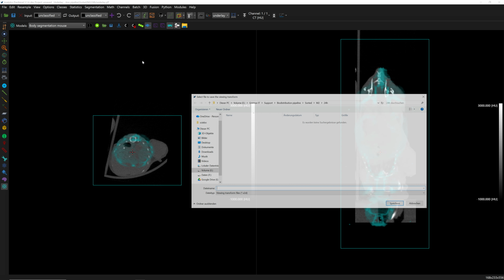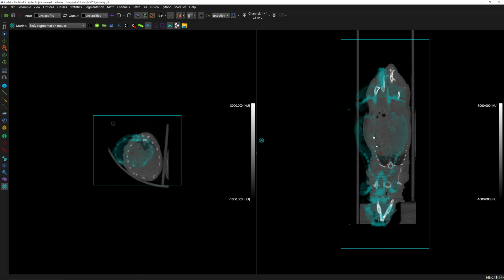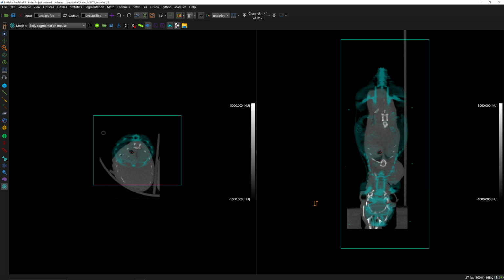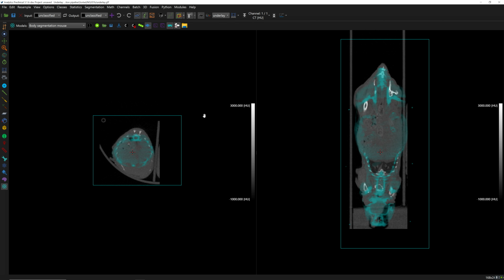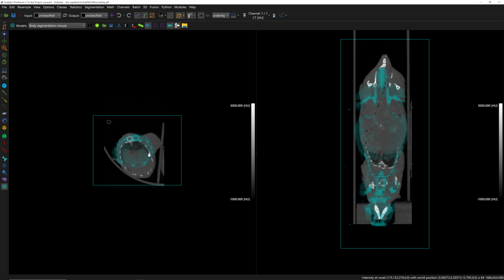Next one. So almost done. Now it's M3, 4 hours time point.